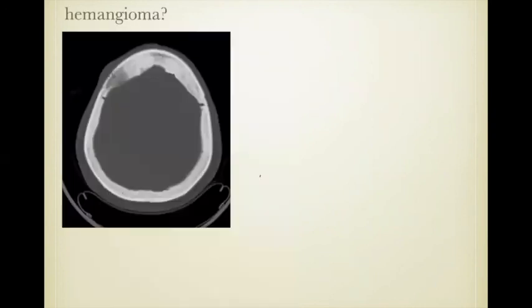Now, this is a 3-year-old with this mass that you can see not very well in this image, but it's on both inside and outside. Here you see it a little better. It looks like there's some striation, but this is a destructive lesion that's going through the skull, has a component inside and outside. The patient has a history of acute myelogenous leukemia, and this is a chloroma. So again, a disease that you really should only be offering as a possibility in patients with either chronic or acute myelogenous leukemia. It's unique to that disease.